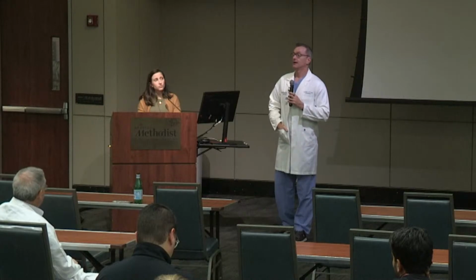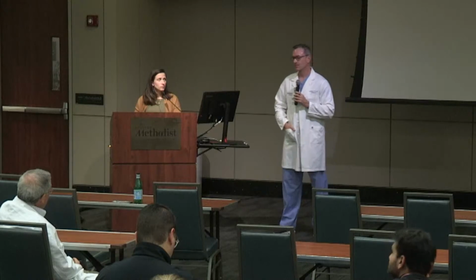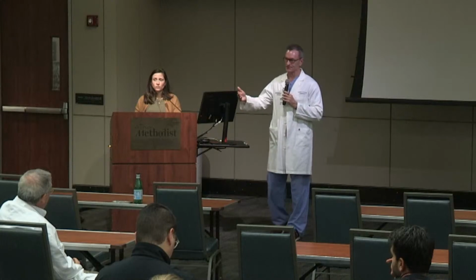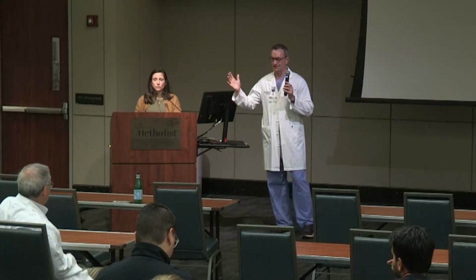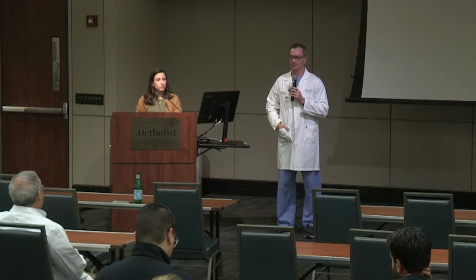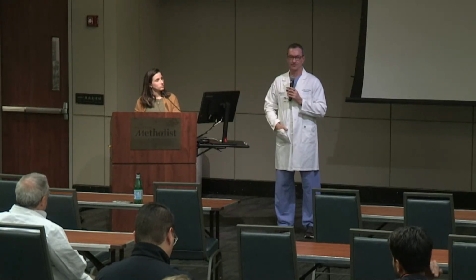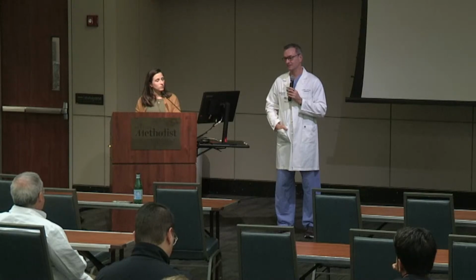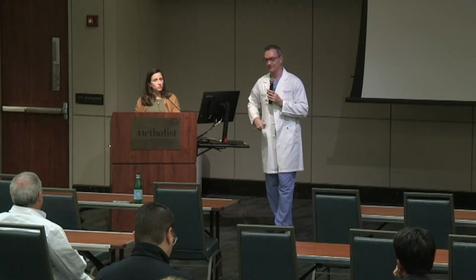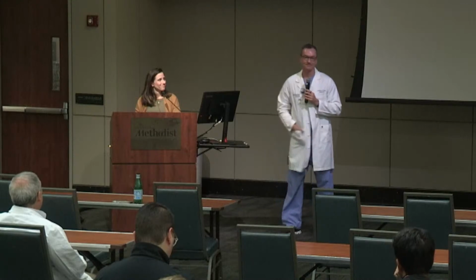Yeah, the TTVRs need anticoagulation, and that's another big unknown. Early days, but they're starting to have more and more reports of thrombosis because of the massive atria. Even without AFib, they can't, if AFib, they get anticoagulation, but they have to be anticoagulated for at least 3 months, and there are signs that maybe that 3 months should be longer. Even without the anticoagulation, they still get structural valve deterioration, just like any prosthetic valve. The clips don't deteriorate. The tissue around them might, but the clips don't deteriorate. So there's a lot of different camps and a lot of opinion, but actually no data.